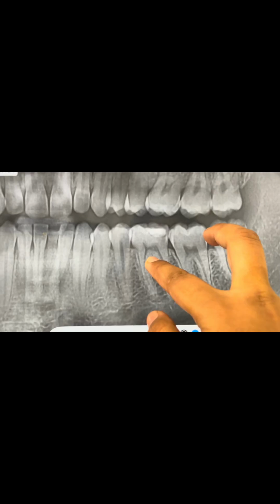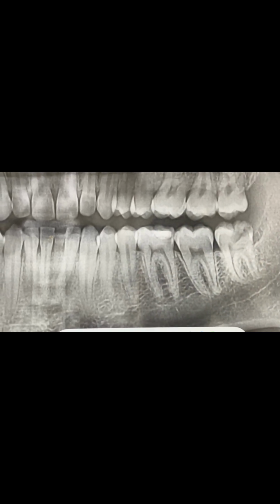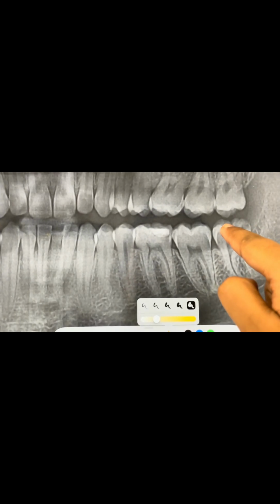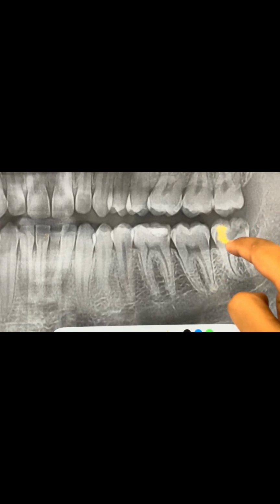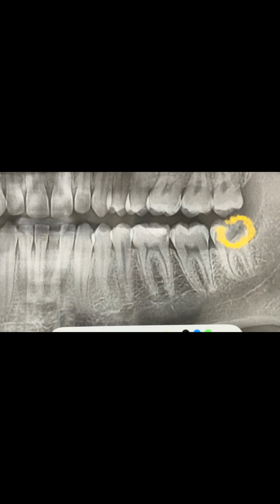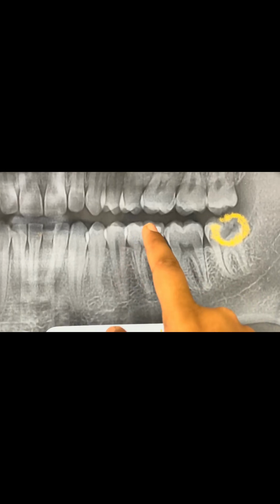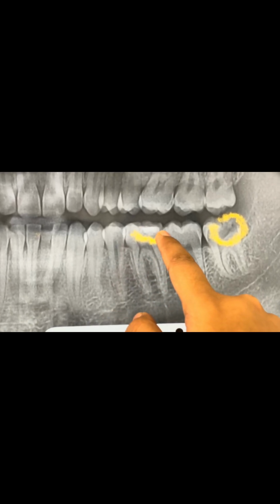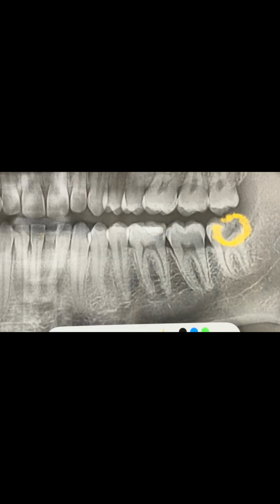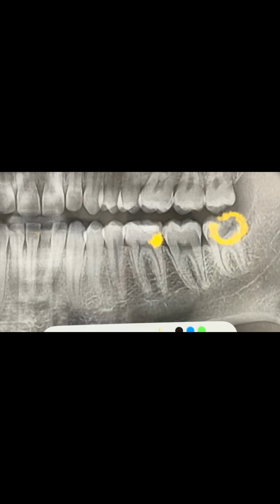On the left side, you can see this patient presented with the chief complaint of pain on the lower left back region. And here, as we can very clearly see, there is a radiolucency in the enamel as well as dentine that extends very closely towards the pulpal area. This was causing him pain. But unrelated findings that we can see here is, again, a previous restoration that had been done. Slight halo of radiolucency as well as a shadow that is marked over here.